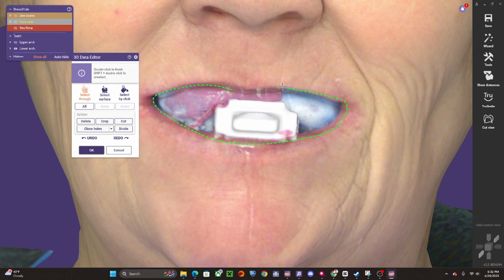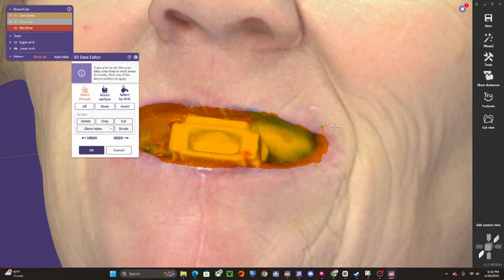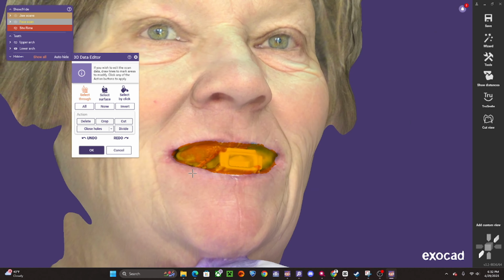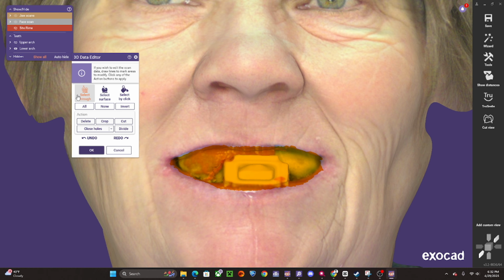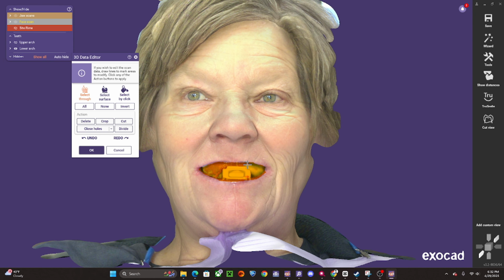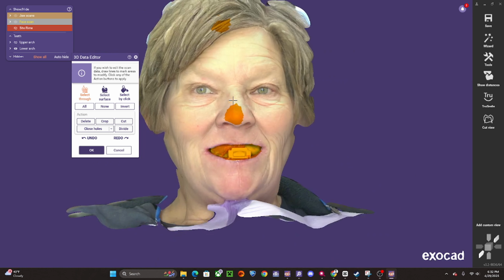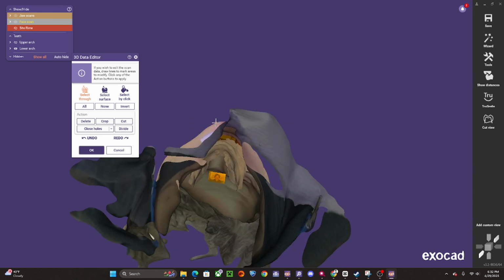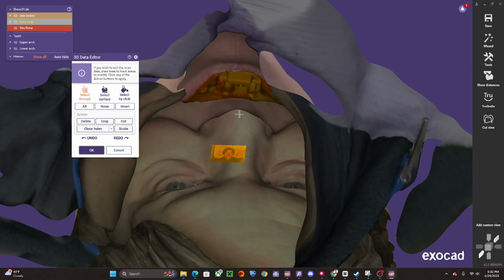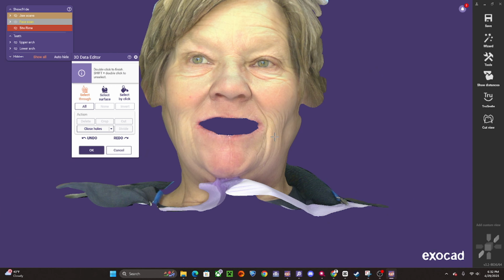And we're going to select around the mouth, and we can delete anything that is the inner lip, right? I don't want to do the outer lip, but just the inner lip. So select through allowed us to select all of our data, but be careful with select through. Say I'm cutting the nose, I can select also the hair. It's selecting through the entire selection. So I did have a photo inside of there on accident. So I'm going to delete all that. And we just have our trimmed face scan, right?